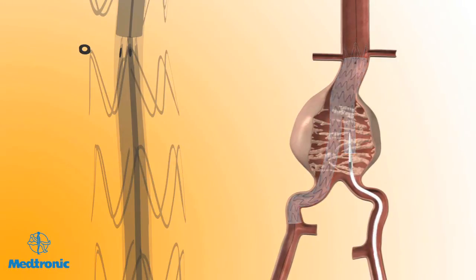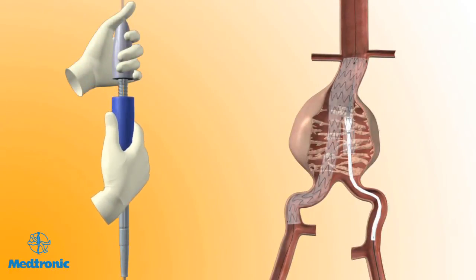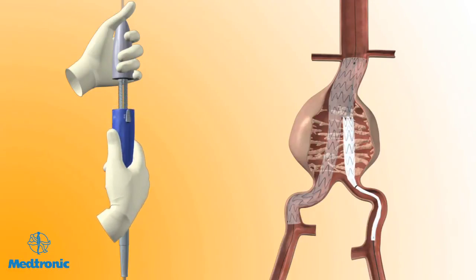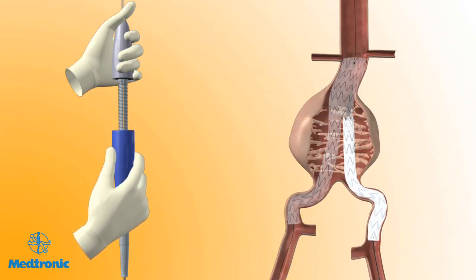The radiopaque markers at the proximal end of the contralateral limb should be aligned to the radiopaque marker at the bifurcation of the bifurcated stent graft. Hold the front grip of the delivery system stationary. Then, slowly withdraw the graft cover with the other hand by rotating the slider counterclockwise. At any point, use your thumb to pull the trigger on the slider and pull the slider back all the way to finish deploying the stent graft.